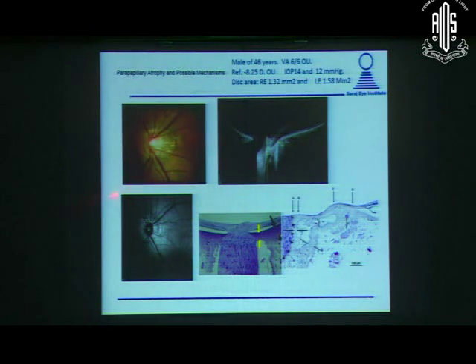So if you had a circle around this area, and the circle of OCT retinal nerve fiber layer crossed this area, then because there is so much atrophy of the retinal layers, you'll see the line dipping down, and it's not such a good scan to be able to correlate. This also tells us where the CSF lies in the area of parapapillary atrophy, just beneath it.